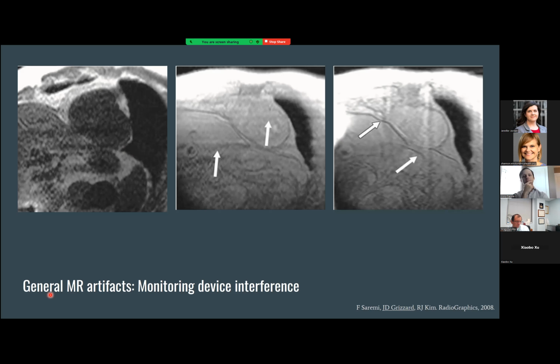Then when the perfusion images are acquired in B and C, if we switch our phase encoding direction, we get vertical lines as well. So that can cause some artifacts that in the case of perfusion would go right across our area of interest.